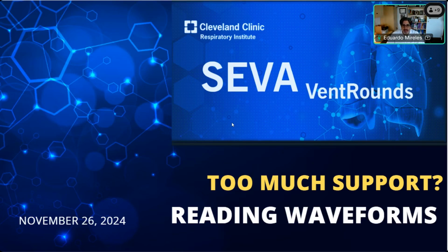Today is SEVA VentRounds, and the question is too much support. And again, we're focusing today on reading the waveforms.